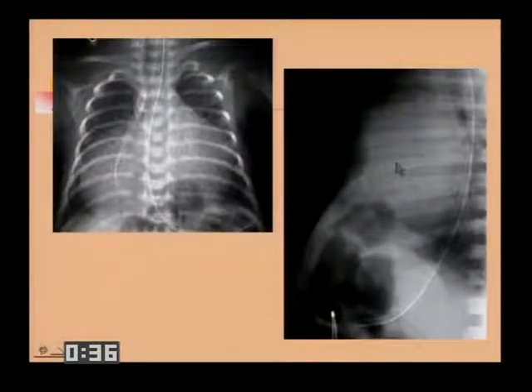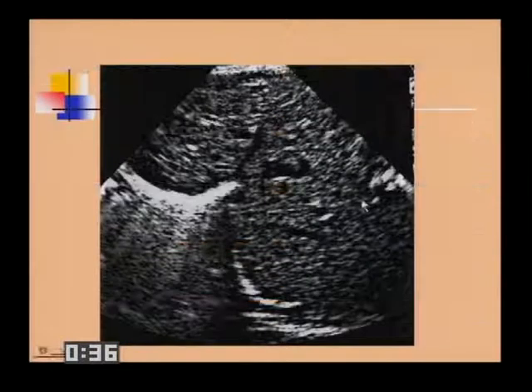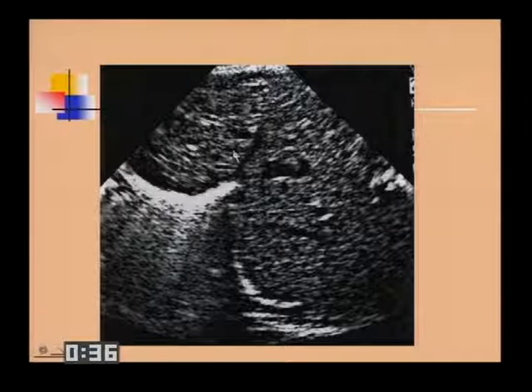You can have other masses at the thoracic base. I've seen a child who had a pericardial cyst that looked like this. I've seen sequestrations that look like this. The tip-off in this child is that there's a little bit of gas higher than it ought to be. While most of the hernias, and we're going to show some, are in the back, and I refer to as Bochdalek, this little piece of gas coming up in the front tells you that there's some discontinuity in the anterior portion of the diaphragm, and this then is a foramen of Morgagni hernia, and we've got liver coming up into that region. So that's what the soft tissue density is.